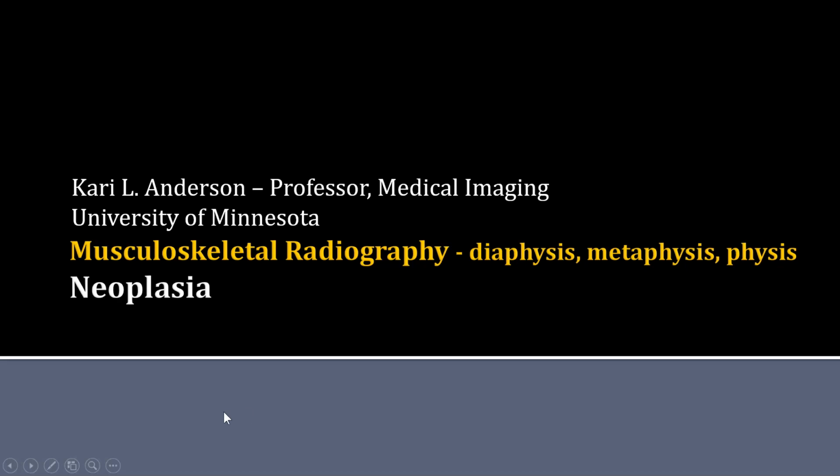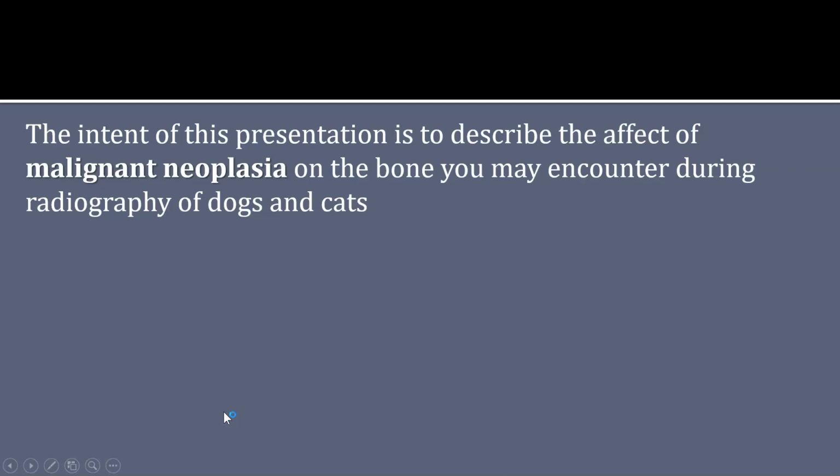This is the fifth in a series of presentations on the topic of disorders predominantly affecting the diaphysis, metaphysis, and physis in veterinary patients. In this presentation, we're going to describe the effect of malignant neoplasia on the bone that you may encounter during radiography of dogs and cats.